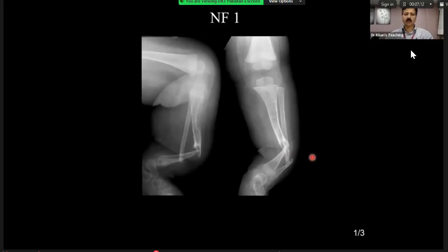I've shown you cases. It's an aunt mini type of appearance. Nothing else can give you this kind of appearance. Of course, post-trauma is a different world, and post-infection is a different world. Clinically, also, that will be different. So this is bone dysplasia, which can come as a long case also.